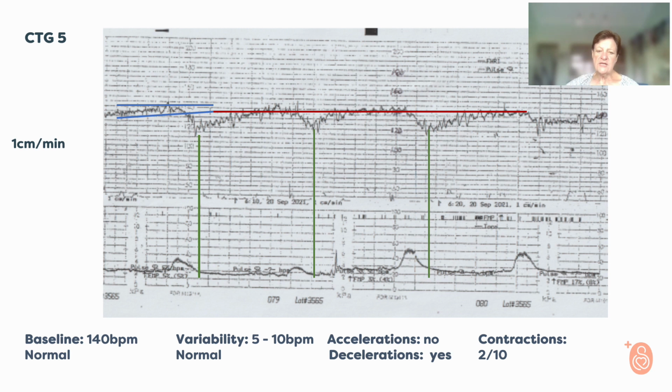Now, we also need to see how much the fetal heart rate decelerates. We have said this is 120 beats per minute, more or less here. That's 140. So it decelerates from 140 to 120 beats per minute. So the deceleration is about 20 beats per minute.